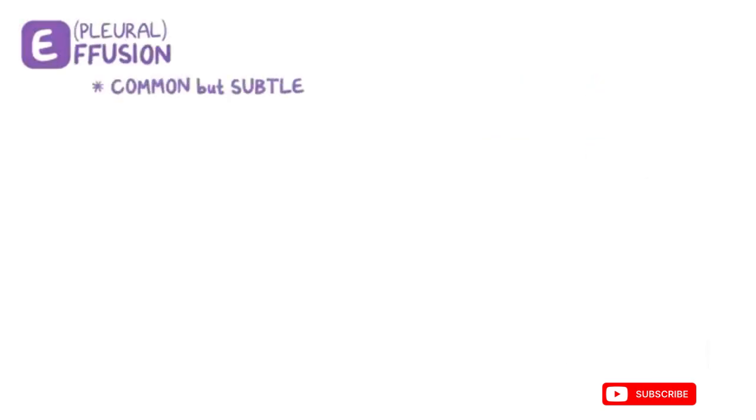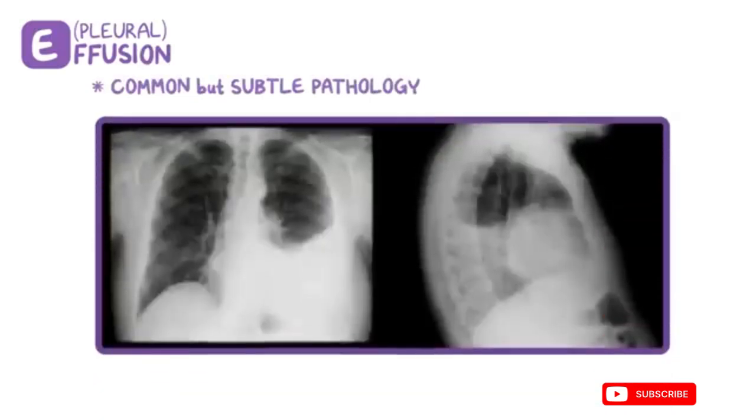E is also a reminder to check for a pleural effusion, which is a common but subtle form of pathology that you can see on an X-ray. Pleural effusions are fluid that collects at the costophrenic angle, and causes blunting of the normally sharp costophrenic angle.